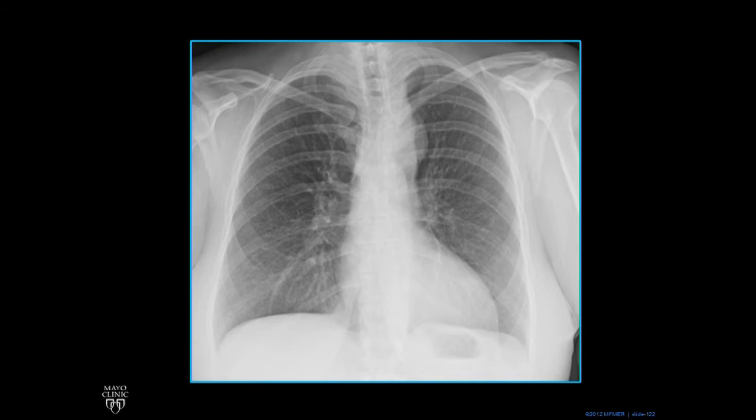New patient. Look at the region of the aortic arch. What do we see? There's one contour and another contour. Gee, we were only supposed to have one. Now we have two. There are going to be two structures that have separate interfaces with the lung. It's a double contour.